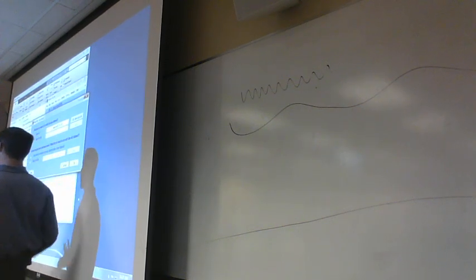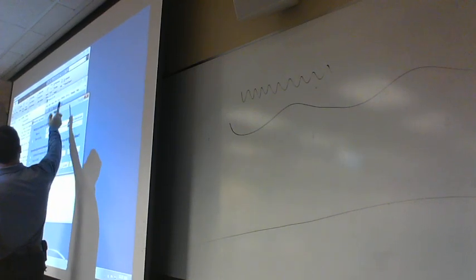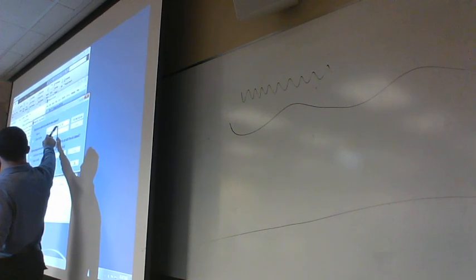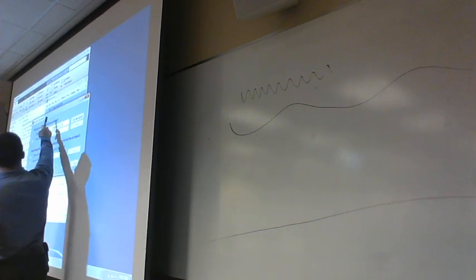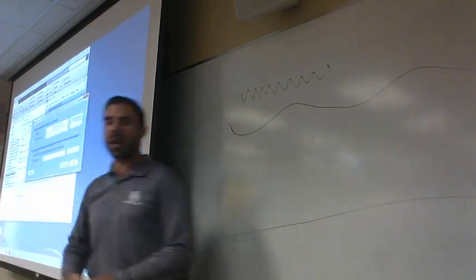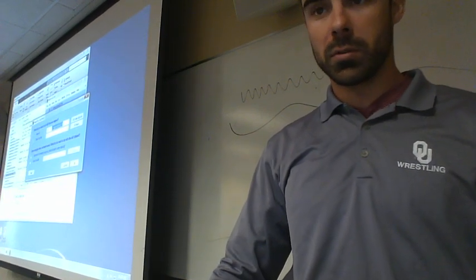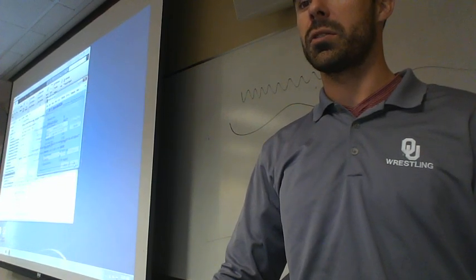The way this works is we can name it, and it becomes an extra data set up here, but we can also save it. If we save it, then it's also saved in our folder, the folder that we sent it to. So why don't we do that and also check the box for save as file. You can just copy that name and paste it in there. Just hit OK.